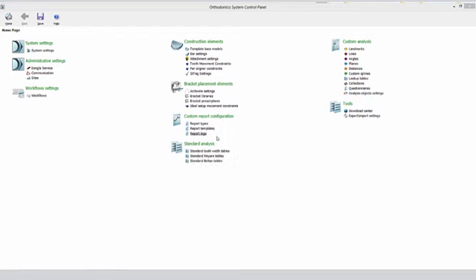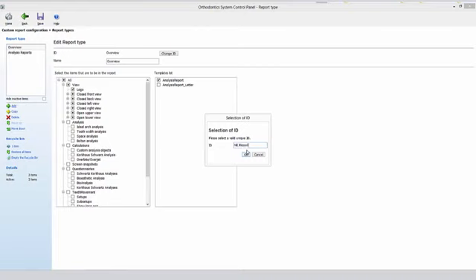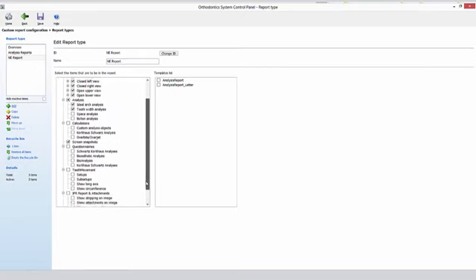Communication is always key in any kind of analysis, and this software allows you to customize your report. You select or choose a new name for your report, and you select then from screenshots, calculations, teeth movements you wish to communicate, and of course, very important, the areas where IPR, interproximal reduction, was performed.